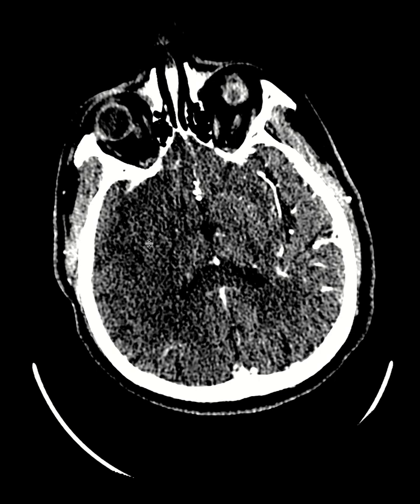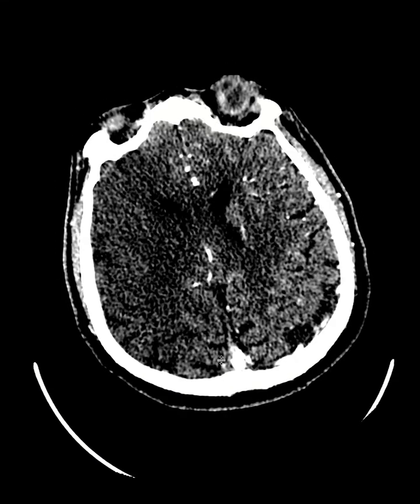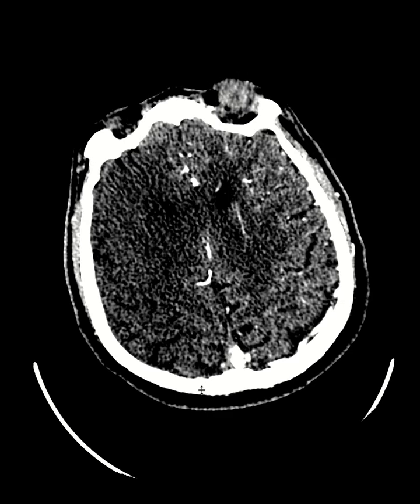So these are some fancy terms that you need to know for your exams. They used to use these kinds of signs when they didn't have CTA or CT perfusion. But nowadays we just jump into the CT perfusion and we can estimate which areas are getting infarcted, and obviously we have MRI as well.